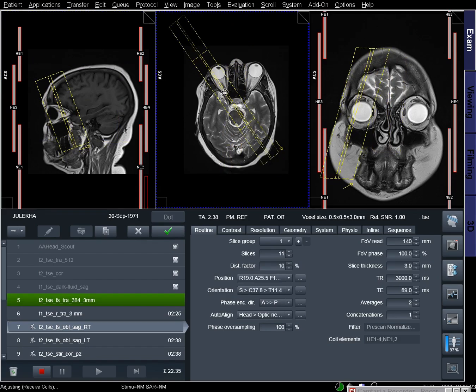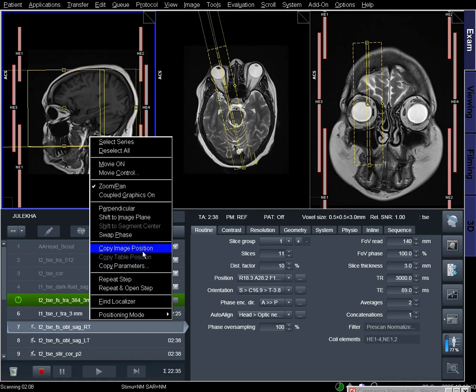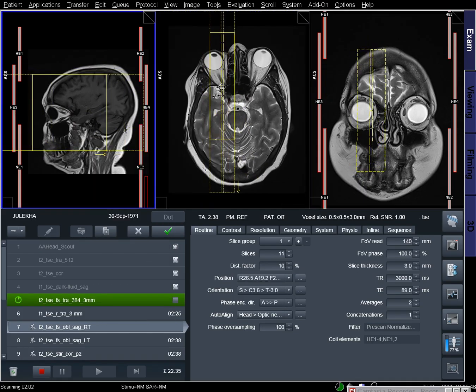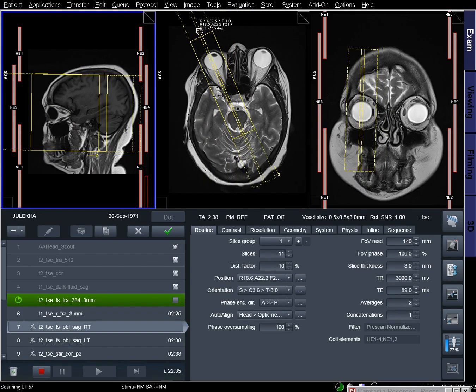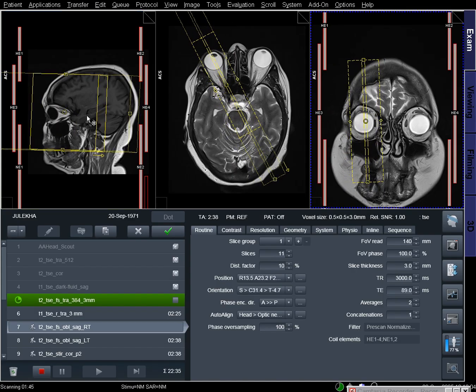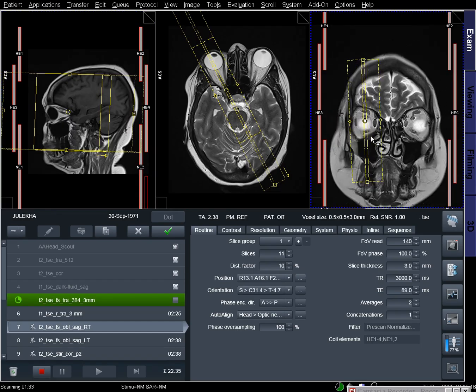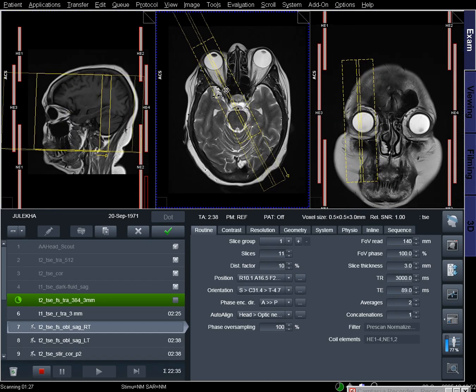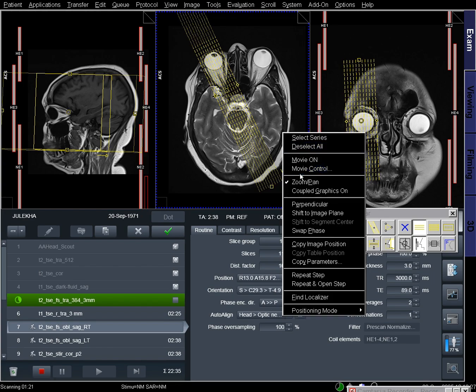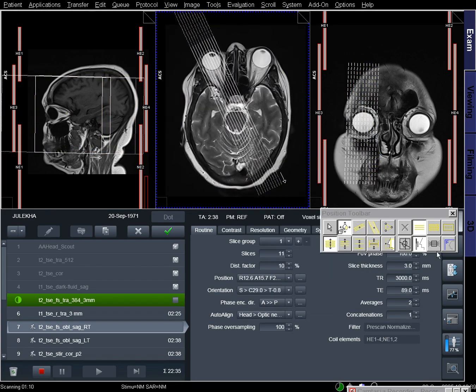T2 sagittal oblique RT. Plan the sagittal slices on the axial plane and angle the planning block parallel to the optic nerve. Check the planning block in the other two planes. An appropriate angle must be given in the coronal plane, parallel to the line along the right RT superior and RT inferior rectus muscles. Ensure that the slices are sufficient to cover the right RT orbit.